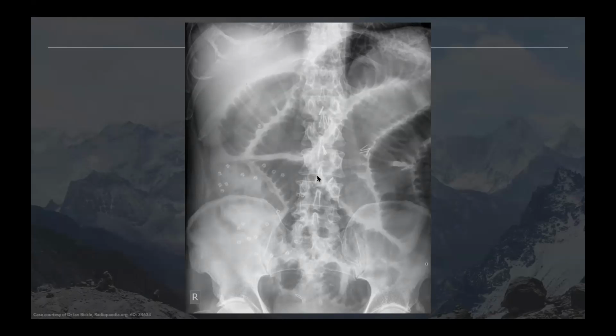So if I was in an exam, I would say something like, this is an abdominal radiograph. There are multiple loops of dilated bowel centrally with valvulae coniventes spanning the full width of the bowel lumen. This would be consistent with small bowel obstruction. There's no evidence of perforation. The bones appear normal. And then I would say there is evidence of previous surgery. Therefore, this is most likely adhesional small bowel obstruction. The adhesions being caused by previous surgery.